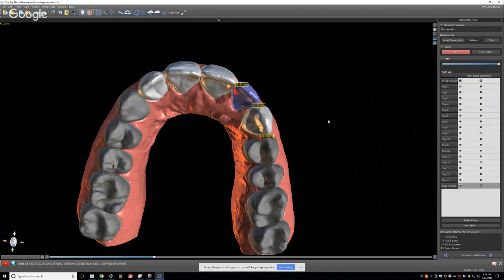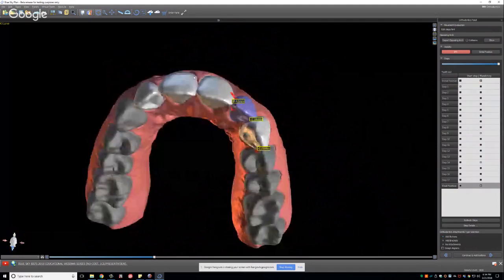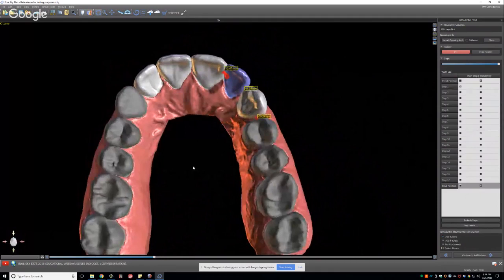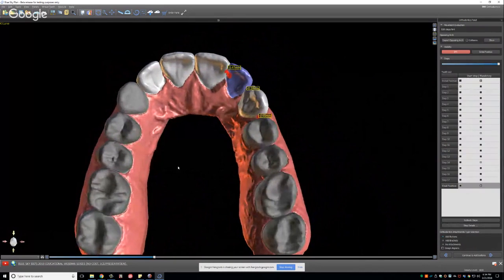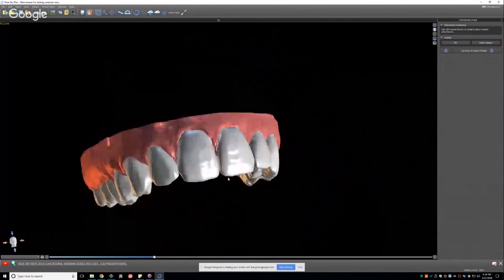And the amount of post-print processing, meaning if you designed and printed your aligner, the amount of polishing it would take to get it to an acceptable level is just too much. So until we have some materials and some processes that help that out, this is waiting for us, waiting for the materials. The utility is built into the software, but just leave it alone for now. So now we're going to add buttons. Actually, let's go back for a second.